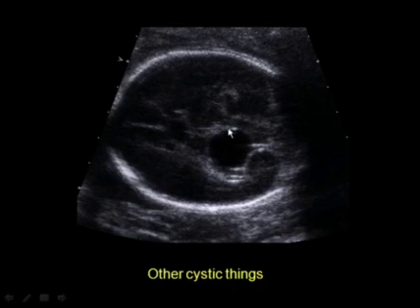Another cystic thing in the brain is this round structure here. It is not in the midline. It's off-center on one side. It's posteriorly and related to the tentorium, seen underneath the temporal occipital lobe region here, and this is an arachnoid cyst.